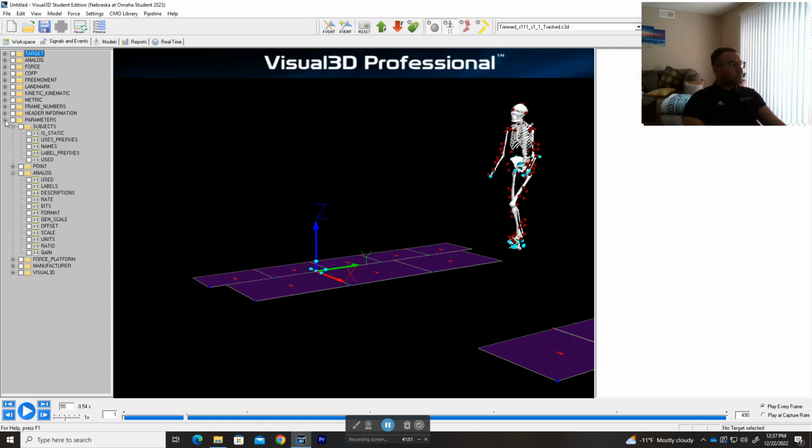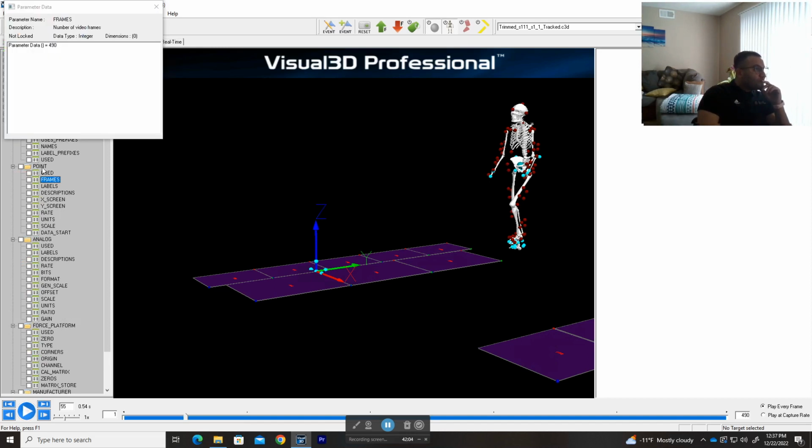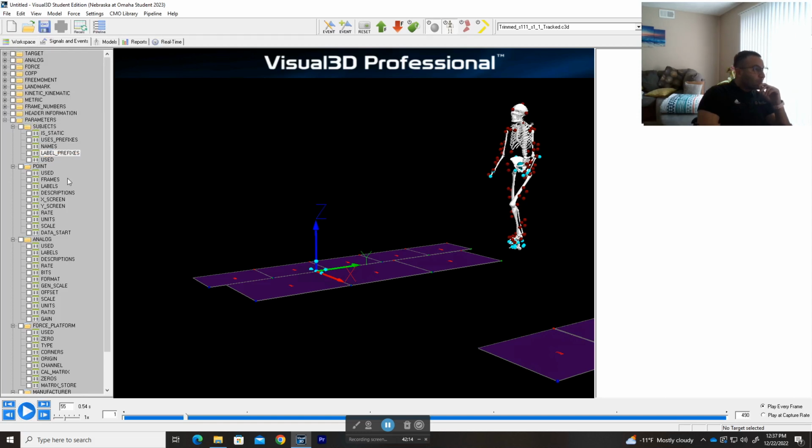So when you go to parameters, you have the subject, points.